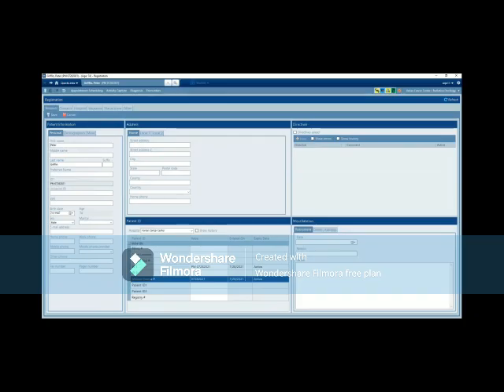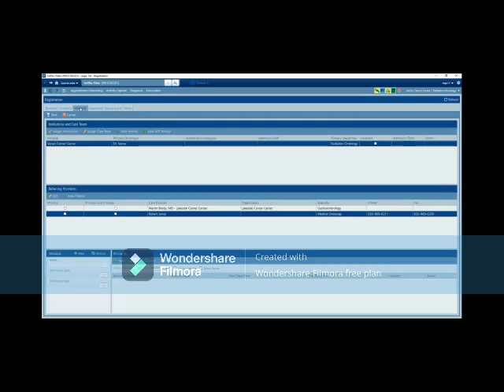Modifying the list of external organizations and providers at external organizations linked to a patient can be performed in the ARIA registration workspace. Select the Hospital tab in ARIA after opening the patient in the registration workspace. On the Hospital tab of the registration workspace, the Referring Providers section now displays the external organizations and providers at external organizations with the referring physicians which are linked to the patient.